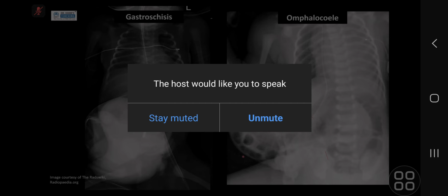So in gastroschisis, because it's just bowel, often, I think in one of the pictures that Toby has, they also put what we call a silo. So it's just a plastic covering over the bowel, which can make it hard to differentiate between gastroschisis and omphalocele. Of course, you can also look for what's herniated within. So if you've got more gas-filled bowel loops, there's bowel, and in omphalocele, there's liver. So it can be easily said there might be something else rather than bowel. The other thing that they might want you to do is an ultrasound to see exactly what's herniated, and you can help to characterize it further.